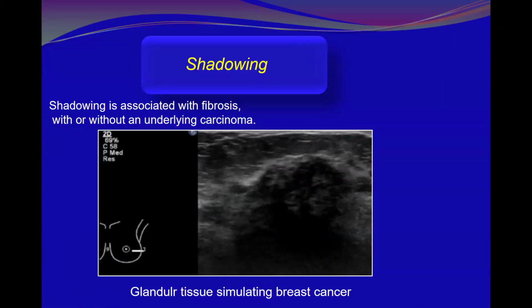Okay. This is only shadowing glandular tissue. It is difficult, but in my experience, I have seen such type of breast, and it is usually very challenging. But definitely, most of the parenchyma will be like this, and most of the time it will be bilateral.